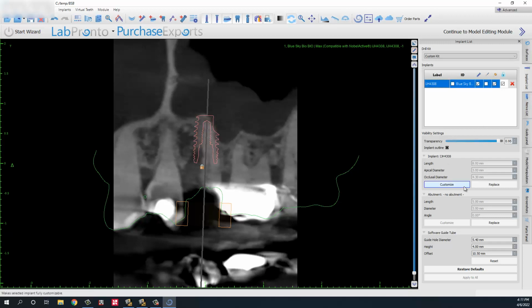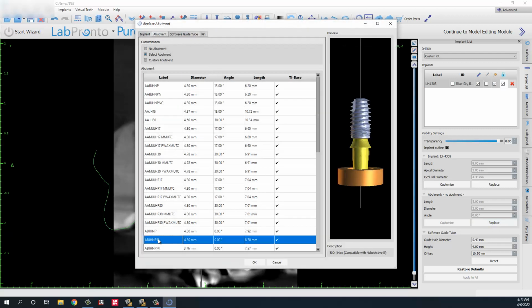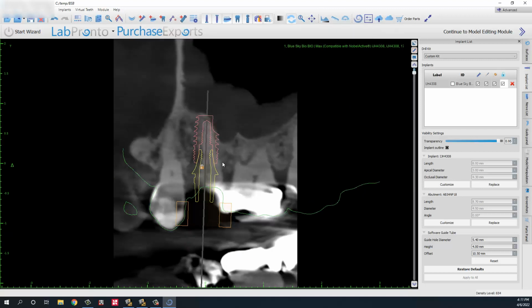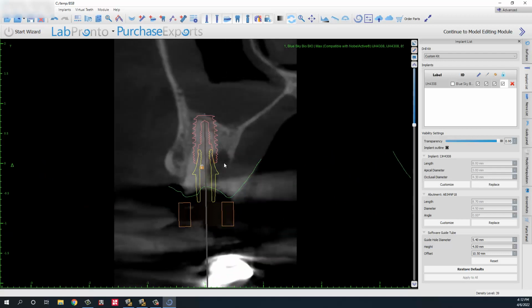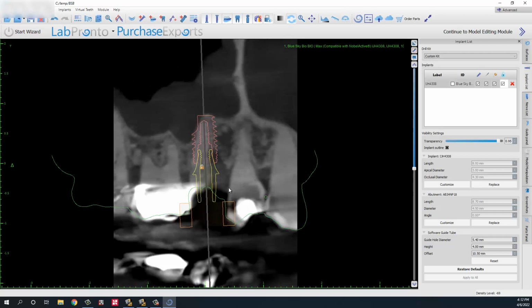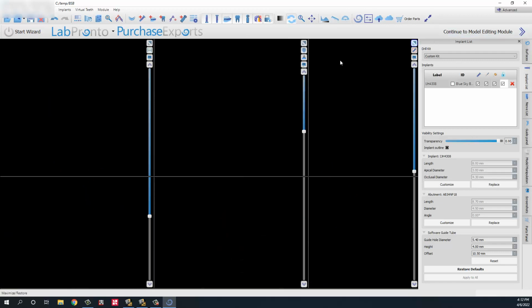If you want to add an abutment, you can. And I like doing that just from a visual perspective. I will admit that I've kind of merged over to doing custom abutments more and more simply because I have the ability in office, and that's kind of cool, but it's not necessary. These Ti-base solutions have worked really well for me over the years, so yeah. Okay, so let's go ahead and make our guide.